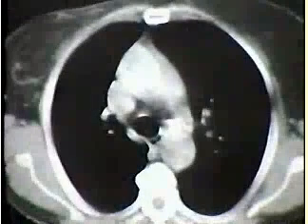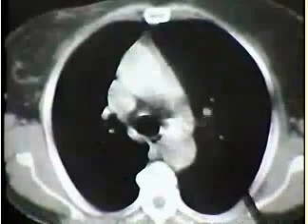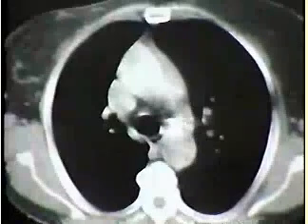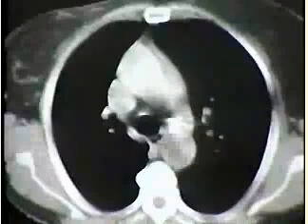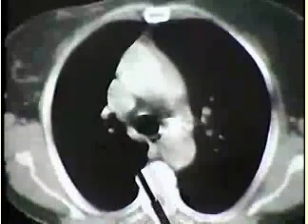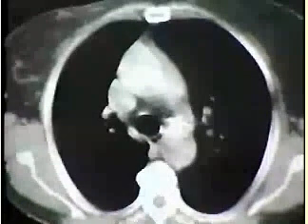And as we go up a little bit further, getting close to the aortic arch, here the calcification along the bottom of the aorta, the AP window. Notice how peculiar this shadow is as the pulmonary artery goes higher along the aorta than it would normally because it's so distended by heart failure. This is a very confusing appearance related, of course, to partial volume effect, and you mustn't confuse that with a mediastinal mass. Notice the portions of the azygous vein that we see as it makes a generous arch and is a generous size in the mediastinum.